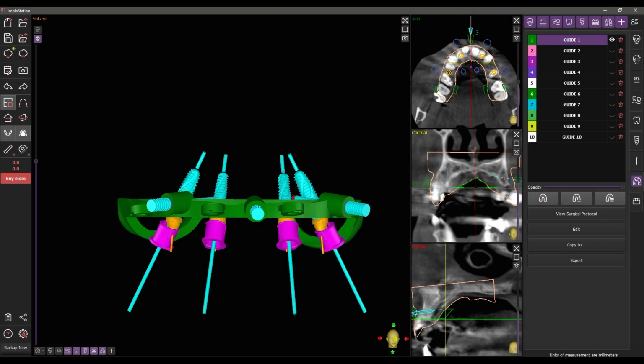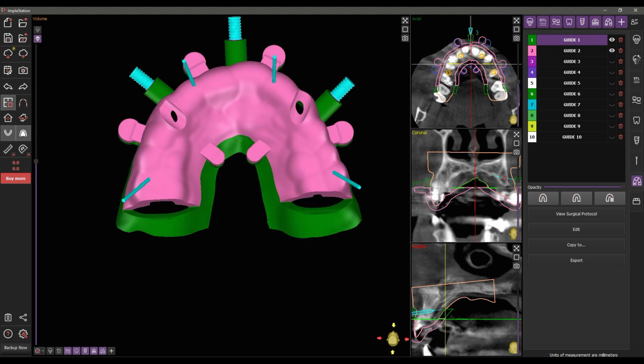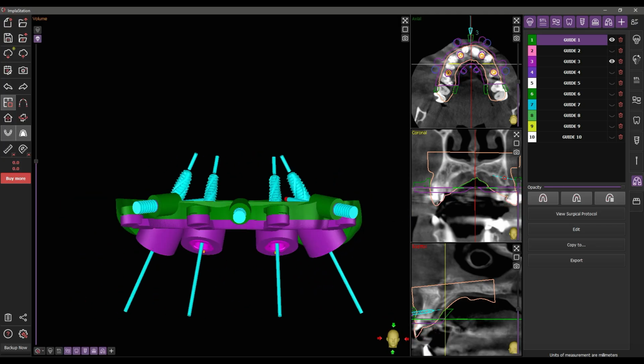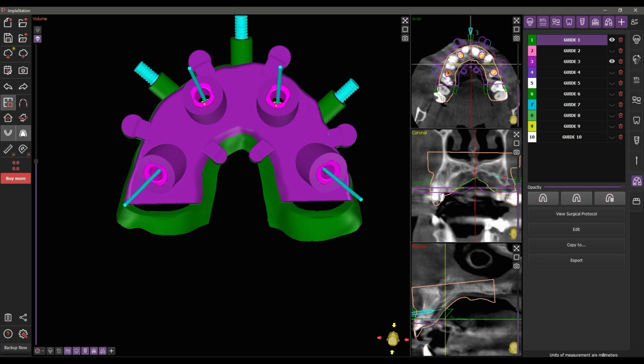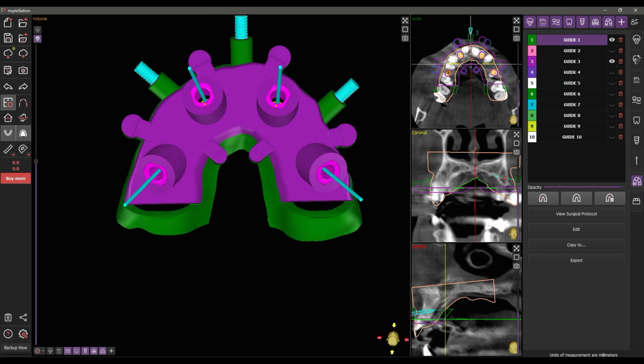As a result of this project, 2 complete guide sets were created, each representing a different type of osteotomy guide. Each set includes a base guide, a positioning guide, an osteotomy guide, a carrier guide, and a temporary construction.